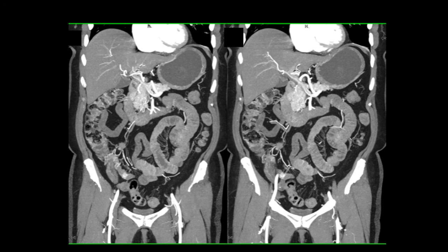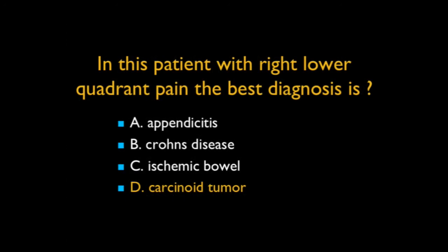And with ischemic bowel, you see hyperemia. Carcinoid tumor, we'll come back to that in a moment. Crohn's disease doesn't explain the vascular small bowel tumor, doesn't explain the mesenteric findings, or maybe explains it a little bit, but you don't see any of the stricturing with Crohn's. But carcinoid, mass, terminal ileum, desmoplastic reaction, mass in mesentery, beautiful example of a carcinoid tumor of the small bowel. That was how we diagnosed it accidentally.